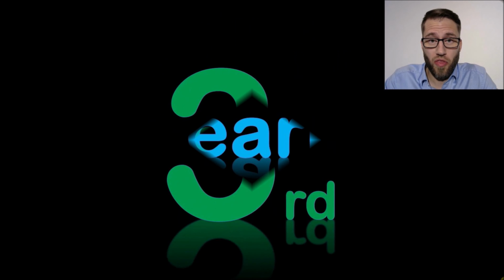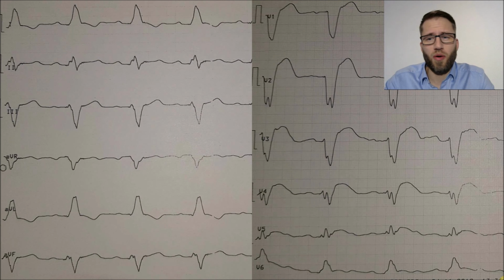What brings us to the third STEMI case I brought to you, and this is a completely different ECG pattern.